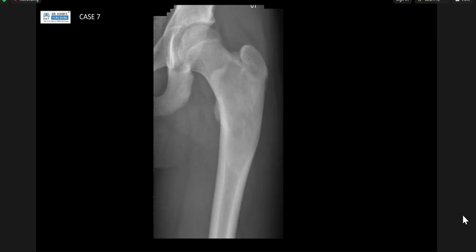Good. Okay, excellent. So yeah, this is a nice example of fibrous dysplasia. They can be mildly expansile, and you get that nice kind of ground glass, smudged appearance internally, which is that fibrous matrix. It tends to be poorly organized.